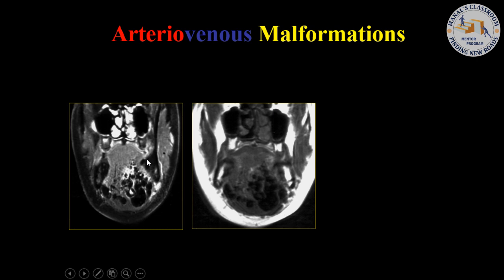Now, one of the things that I run into is that if we see something that looks like this, oftentimes this is called a hemangioma. But it's not a hemangioma because why? It's high flow, which can be in a proliferative phase of a hemangioma, but the hemangioma also contains what? It also contains a lot of soft tissue.